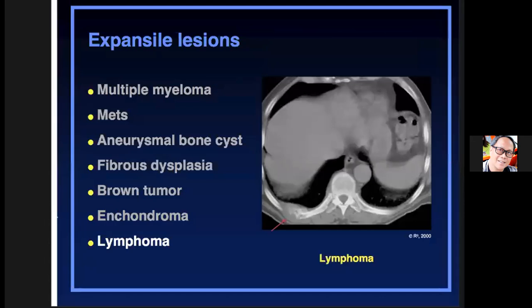Okay. So how about this CT scan? No? It shows you, okay, the red arrow is pointing to rib destruction, or posterior rib destruction. Okay. There's also lytic change and some expansion as well. Okay. So this is most likely a metastatic lesion. The primary is a lymphoma.